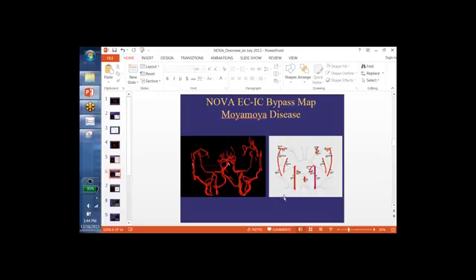We have a specialized map for ECIC bypass that adds the additional labels, annotation, and schematic for an intracranial bypass. Those are performed for Moya-Moya disease, as well as flow replacement to manage giant aneurysms.